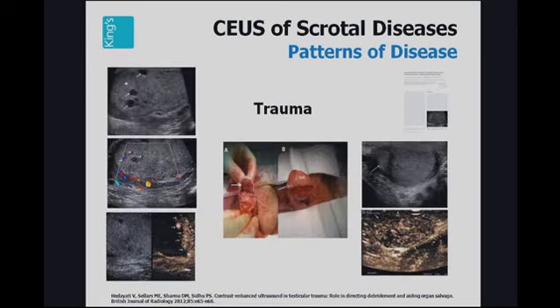Look at this patient. This patient sustained an injury when hit by a very hard ball. On the B-mode ultrasound, there are areas of hematoma present within the upper aspect of the testes, but the colour Doppler ultrasound does not clearly show where the area of demarcation of viable and unviable testicular tissue is.